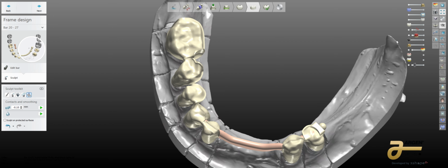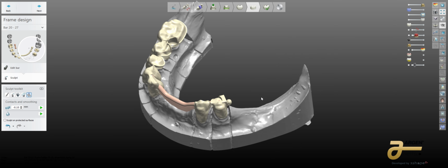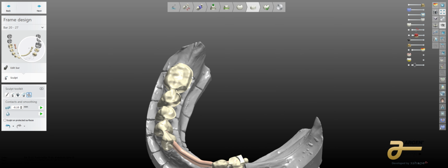Now we have to be really smart about these things as well. Some of the wisdom we've amassed here is, anytime you have a unilateral free end here, this contact to the tissue has to be managed so precisely with relines. Otherwise, every time they bite on this side and that saddle gives a little bit, it's torquing everything and really torquing this side. So that's why having that long arm that's reciprocating and just engaging the tip over here will give some longevity to this side.